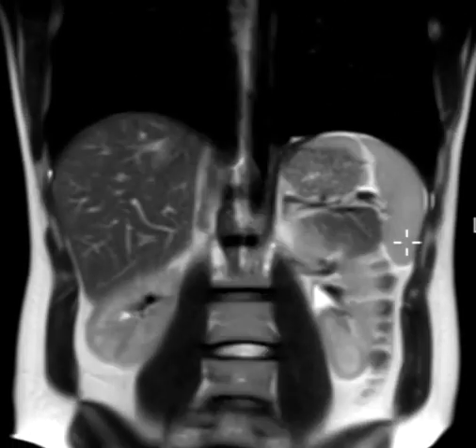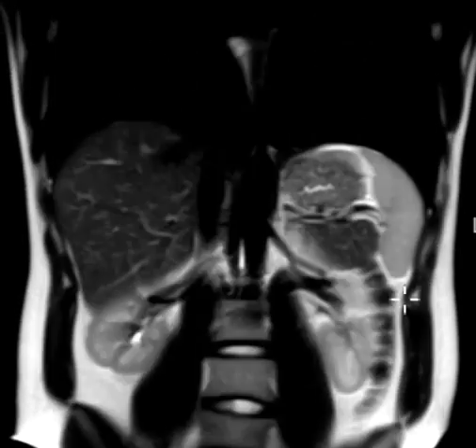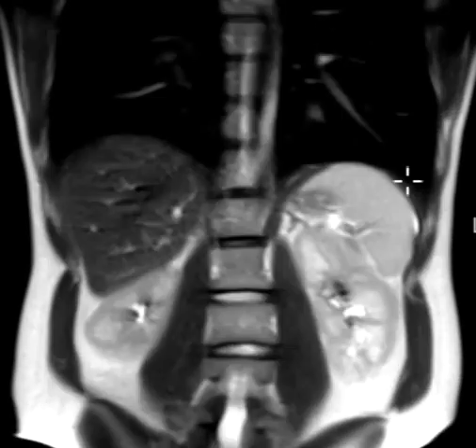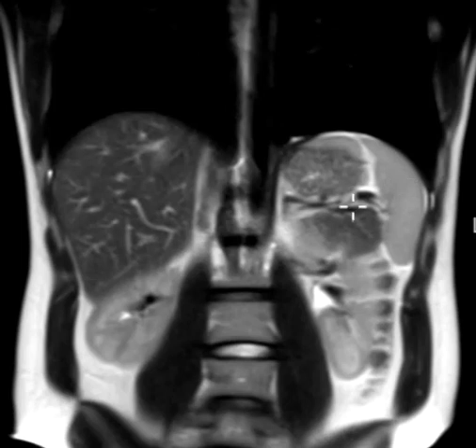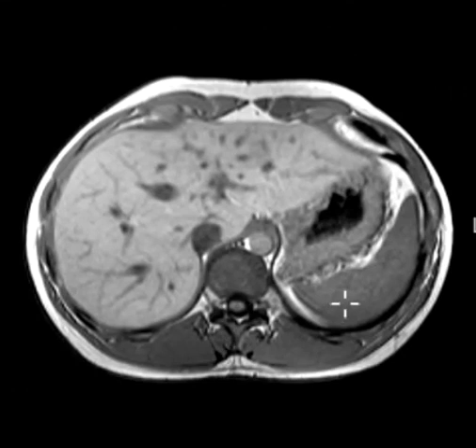Other things can happen with the spleen. They can be injured. So a common thing with CT scan, not so much MRI. We'll do CT scans to the abdomen in trauma to make sure there's no laceration or bleed within the spleen or other organs. We usually do several different sequences where the spleen will look different shades. In this sequence, we see the liver is brighter than the spleen. The spleen is darker now in this one.